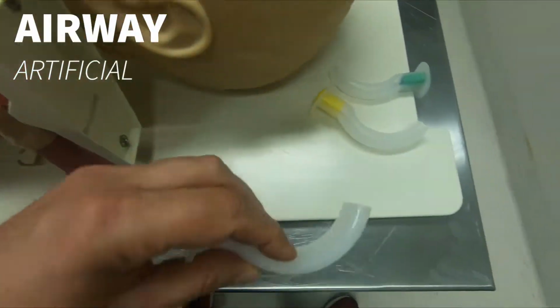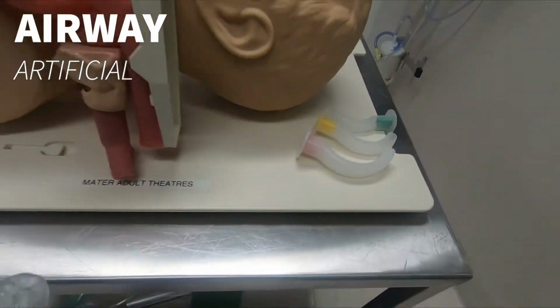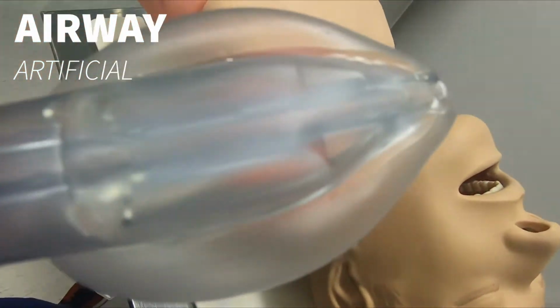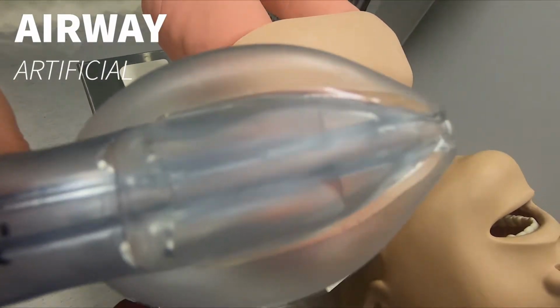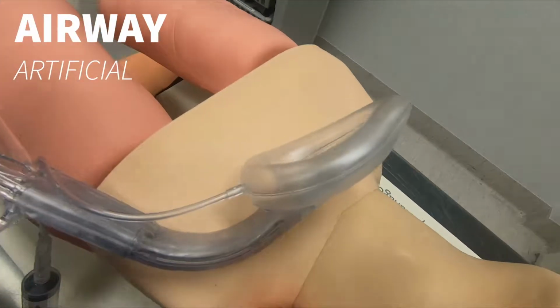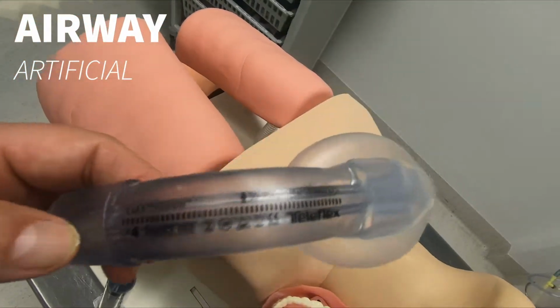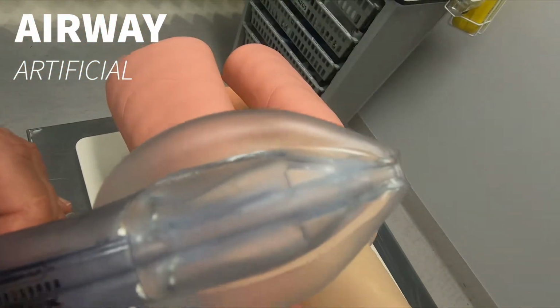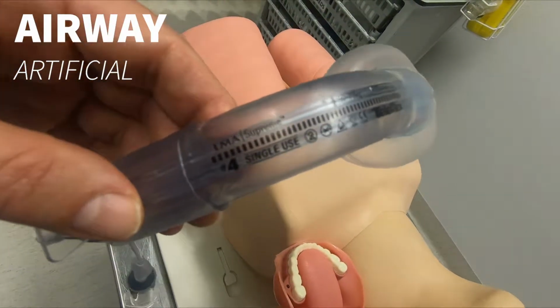Okay. The next level, we're going to the LMA. There are all different types and shapes, invented by Dr. Archie Brain from the UK. This patent was established in 1988, so by 2008, international patents last only for 20 years, we've got all these cheaper disposable models. This particular one is the Supreme. It's a size 4, could be a size bigger, I imagine.